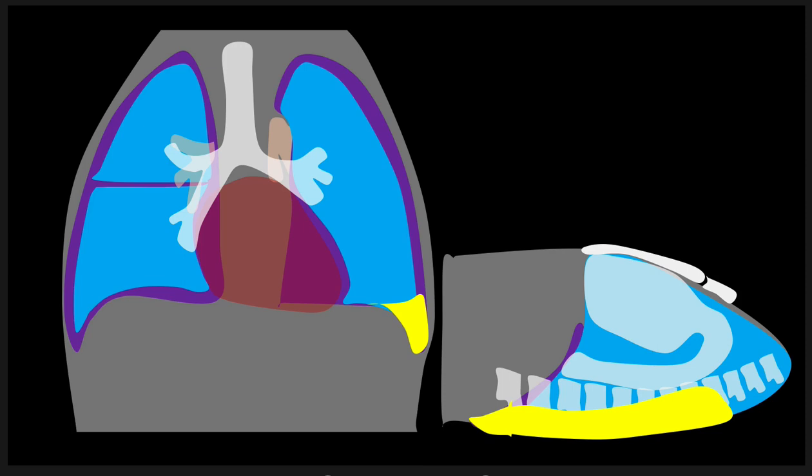When that occurs, you're going to get the development of a curtain-like appearance on the frontal view, like a real pale gray curtain. Depending on how much fluid you've got, it can be totally white or it can be really, really subtle pale gray.